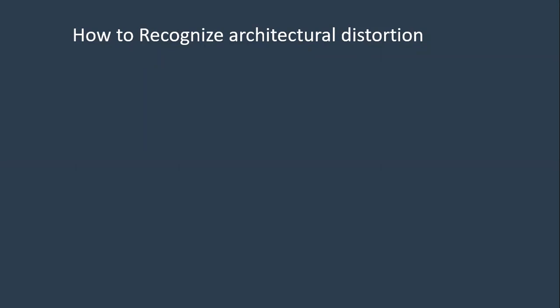This is the architectural distortion. Then how to recognize the architectural distortion?